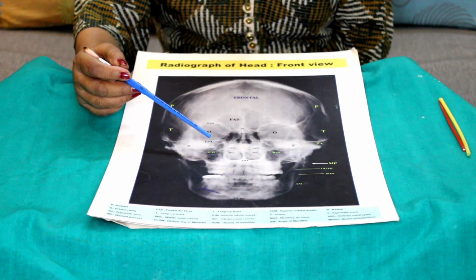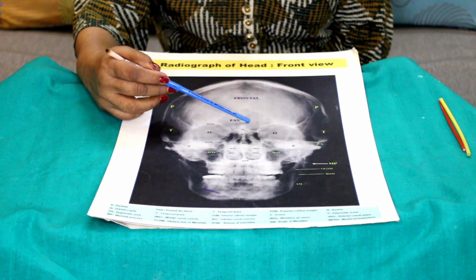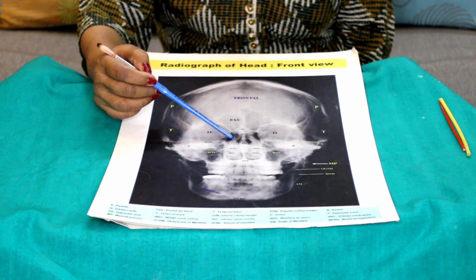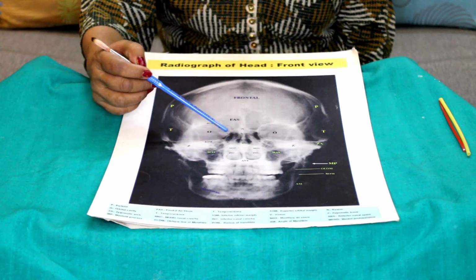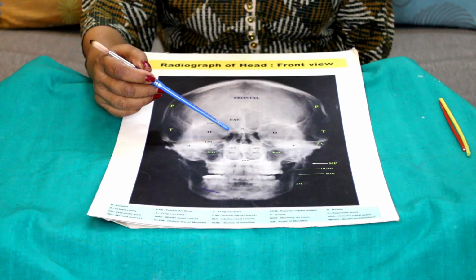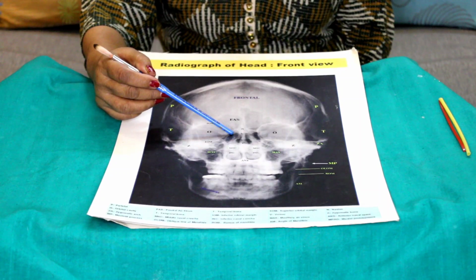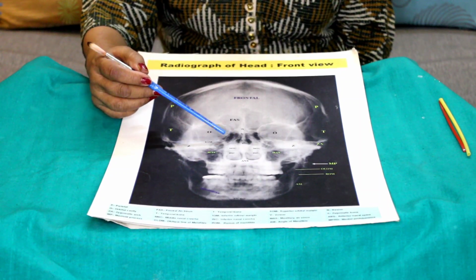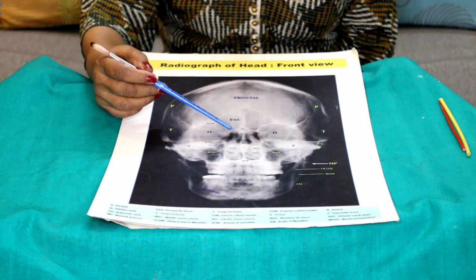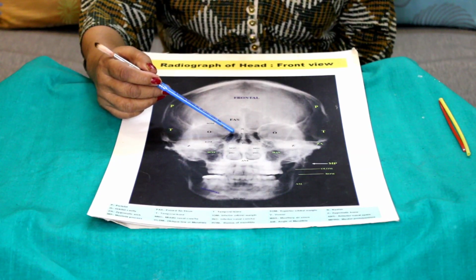Now what are the paranasal sinuses you will see here? You have visualized the frontal air sinus. You will see on the medial wall of the orbit there is some black appearance, and this black appearance represents the ethmoidal group of air cells. There are anterior, middle and posterior groups of ethmoidal air cells. All open into the nasal cavity, only the posterior group enters into the sphenoethmoidal recess.